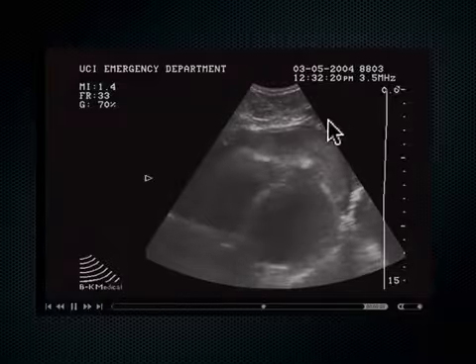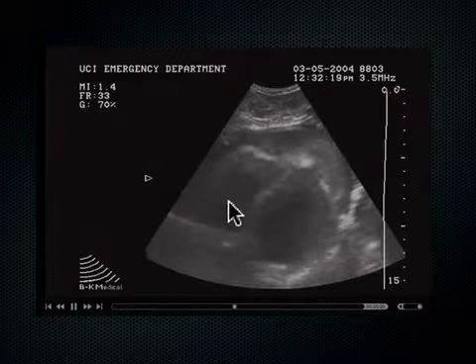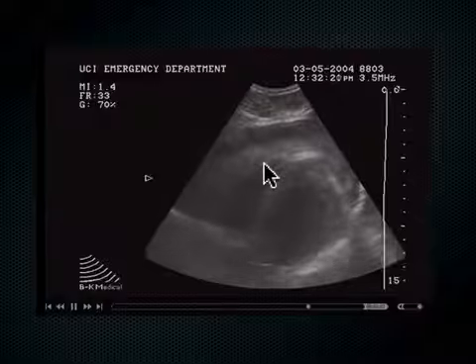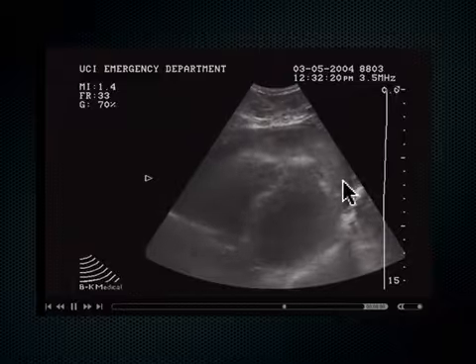Tough to tell. So this is the pericardium over here. I know you start to sound like a radiologist, clinically correlate. This is the RA. The RV is squished. The RV is really hard to see. It's actually squished. So this is tamponade. The question is, what is in here? Is it fat or is it clot?